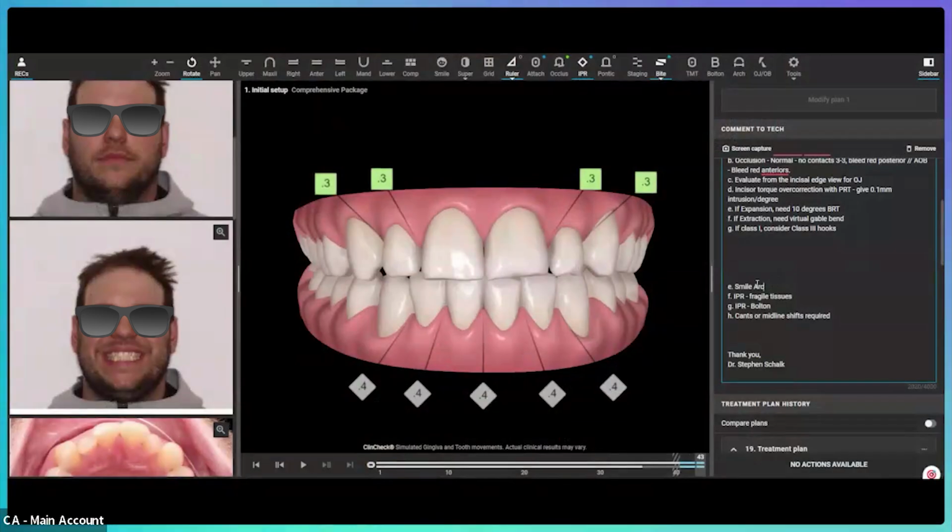But unless you have a midline that's shifted more than 4 millimeters off from your facial midline, that's when it becomes noticeable to dentists and orthodontists, and for lay people, it's even more than that. So I do not have a problem with his midline whatsoever, and we're not going to be making any changes there. We don't need to make significant changes for his smile arc or his midline. If we do anything for smile arc, though, we would focus on extrusion. And he has no cants.